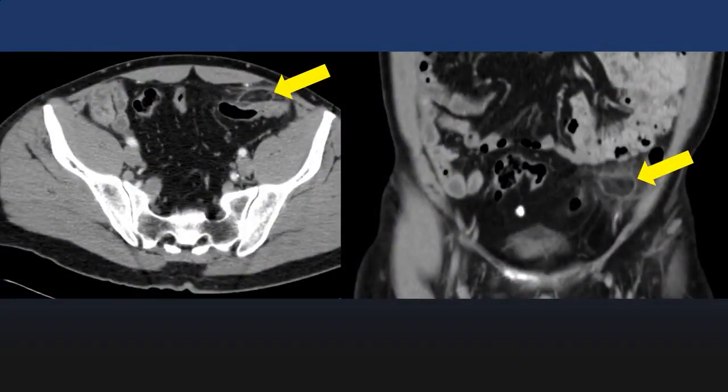Well, here's a person with peritoneal inflammation, certainly less dramatic than that last case of a bladder injury with extraluminal contrast. In this case, there's an oval fat density lesion along the sigmoid colon with surrounding inflammation. There are no associated diverticula, and there's really only one thing this can be. This is epiploic appendagitis, causing this patient's presentation to the ER with left lower quadrant abdominal pain.